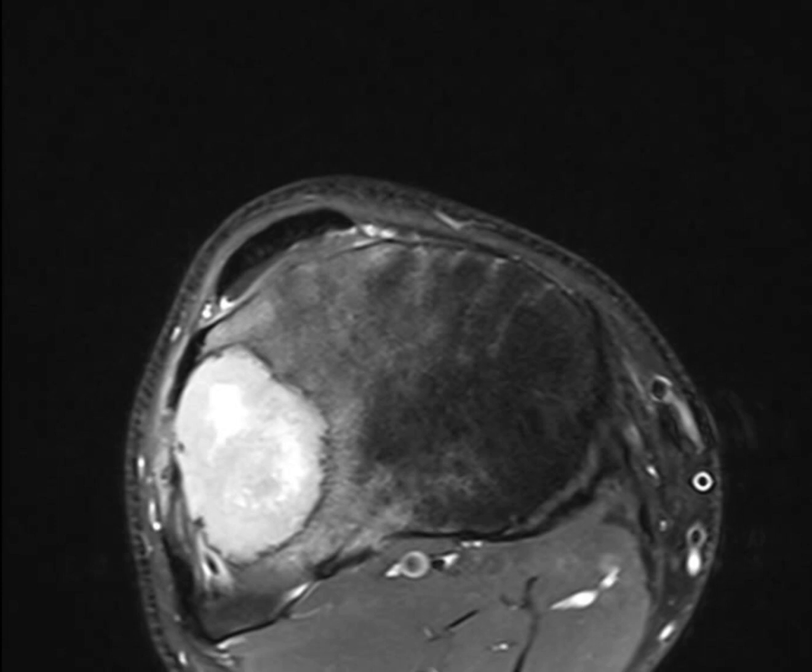What lesion happens in a 25-year-old adult patient, at the end of the bone, crosses the growth plate, reaching the articular surface? One of two: if it's not reaching the articular surface, it's what? Aneurysmal bone cyst. If it's reaching the articular surface, it's what?